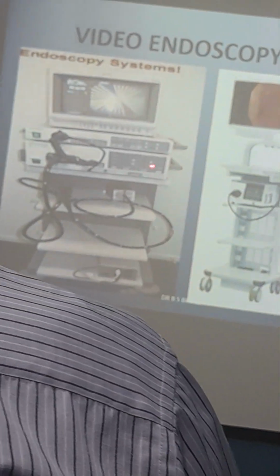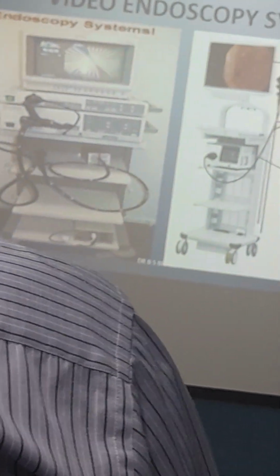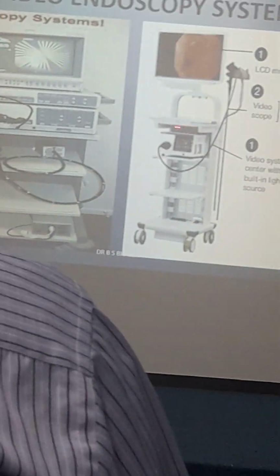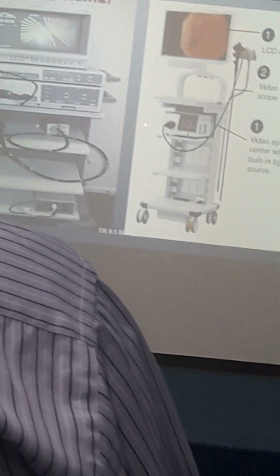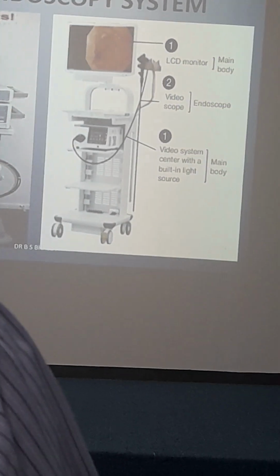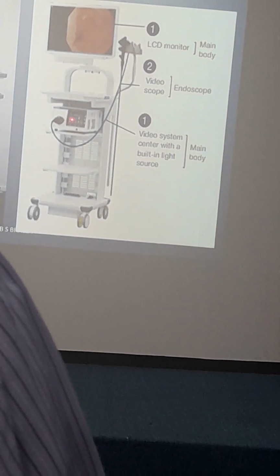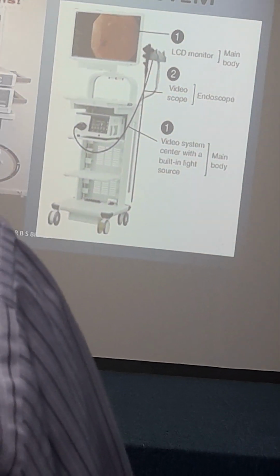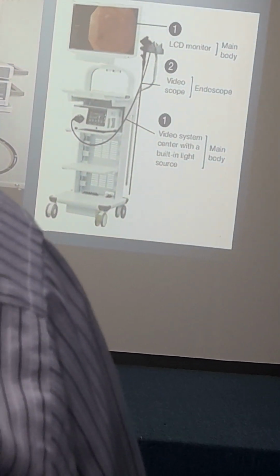So this is that. In some different series, I'm going to show you the standard, but you must know different series, different brands. The features remain the same. For example, this one is a common box rather than having two separate boxes. This is more handy. Some people have a mobile sort of practice. Rather than carrying all these things, you just need to carry this and this. A monitor is usually used. So those kinds of options are available, and they're all video.